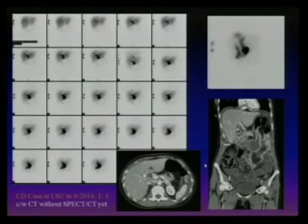Okay, this is our ER case. Ms. Cousin, is it your turn? What do you want to tell the clinician? Patient had a cholecystectomy. Yeah. So you're looking for a bile leak there? Yes. I'm suspecting, based on that, it's leaking. Okay. Yeah, so they have a bile leak. But the question is where the leak is from. Looks like it's from the left. Right, I mean, sorry, going over the right.